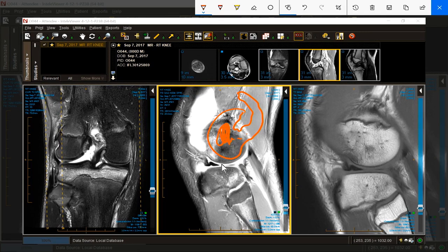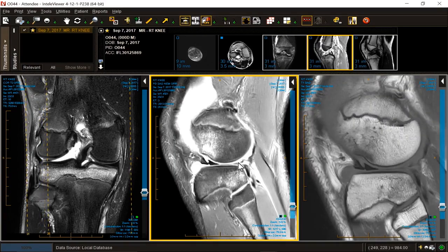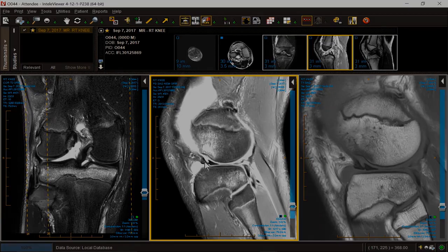Now, sometimes this piece will go underneath in here. Sometimes it'll go over the front. You simply have to follow it. But the fact that we don't have a meniscus in the back and we have a meniscus in the front means we've got a bucket. And what does that mean? That means we want to go to surgery now, this week, so that our bucket can be repaired before it shrivels up into a ball.